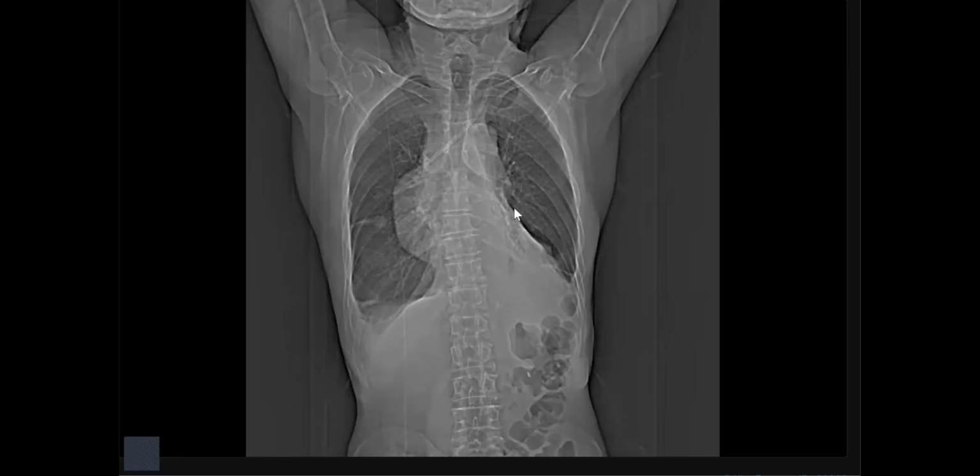Rib deformity. There is no differential density within this opacity, such as calcification or any fluid level. So this is most likely an anterior mediastinal mass in an adult patient. The differentials would include a thymic epithelial lesion or lymphoma. You localize it, okay?